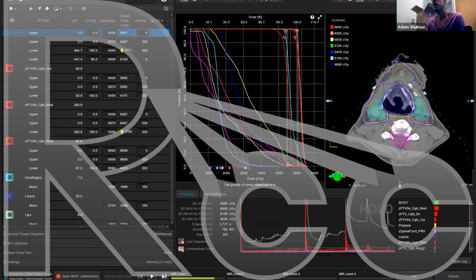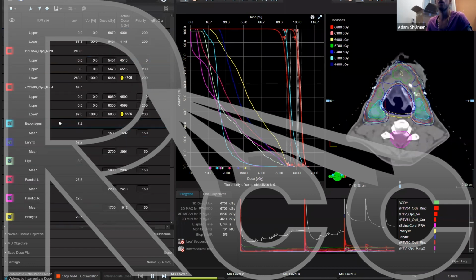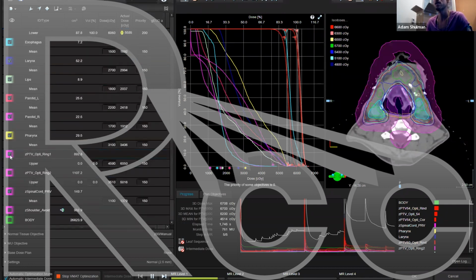Okay, this is leveling out, so we'll go ahead and move on to the next MR level. And I promise you we're getting there. We're getting pretty close already to a finished plan. Our organs at risk are about where we want them to be. We're going to fine tune some of these max doses and then fine tune PTV coverage. Again, if you want, you can always look at your rings.